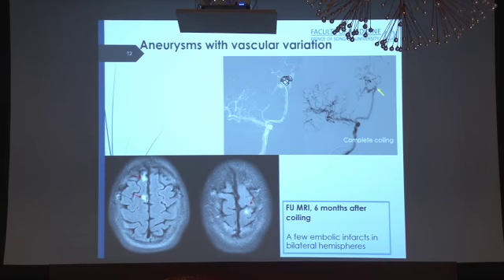As in the lower row images of this patient, you can see there are some embolic infarcts here in bilateral hemispheres after complete occlusion of these aneurysms.